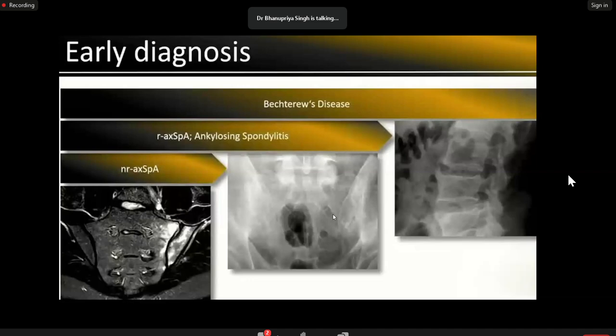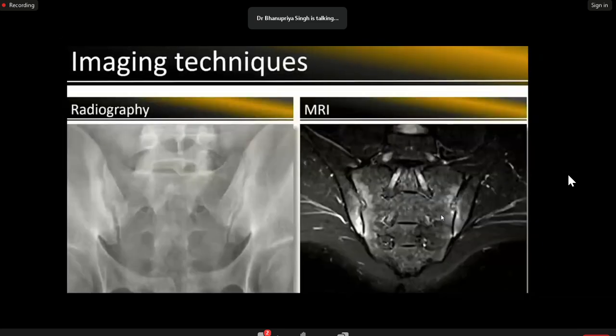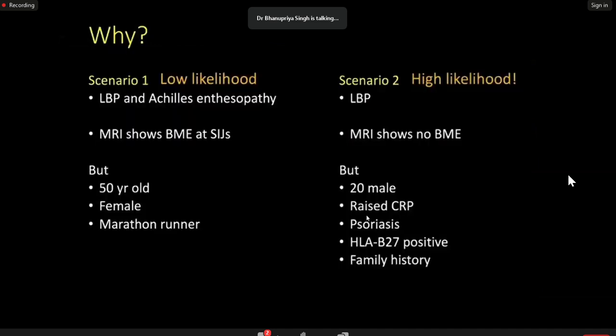Here we see this is radiographic SpA because bilateral ankylosis is seen, and frank ankylosing spondylitis with the Romanus lesions, or the shiny corner sign as we know it, right? Again, we see significant sclerosis around the right sacroiliac joint with some joint narrowing. And here the finding is confirmed with surrounding bone marrow edema.